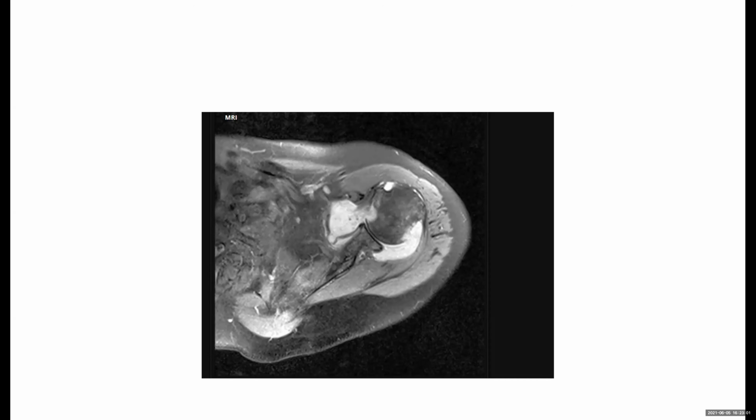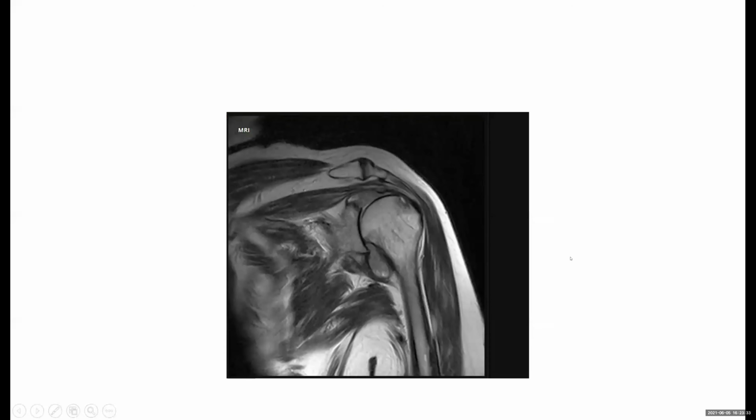You mean a joint effusion? Joint effusion, and there is erosive changes in the head of the humerus. Okay. So can you tell a few differentials? Yeah, it could be possible. There is possibility of Milwaukee syndrome, or even rheumatoid arthritis in the elderly patient, because it is a synovial joint, and also a degenerative process like supraspinatus lesion with the fluid. So the same findings here also.